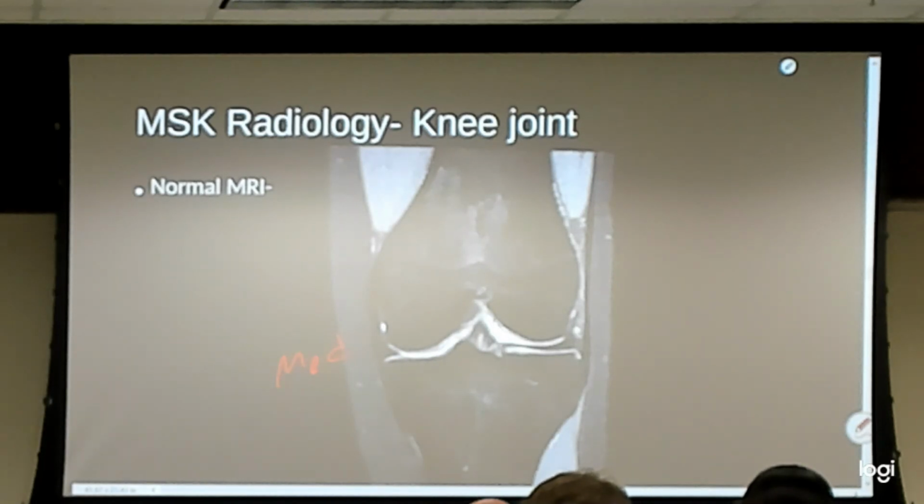That's the menisci. So menisci, yeah, I can do that next. So these are the black triangles. And this one looks more like a horn. It's a very elongated triangle. That's consistent with yours as well. So everything that's smashed between those two cartilage surfaces, it's a black triangle in both weights. So my weight and the weight that you guys have in front of you.